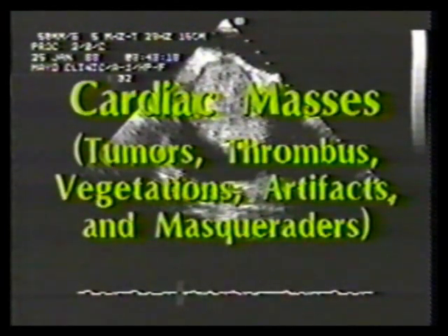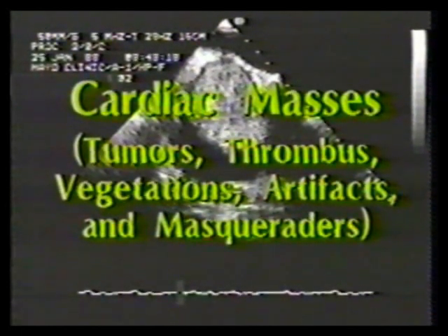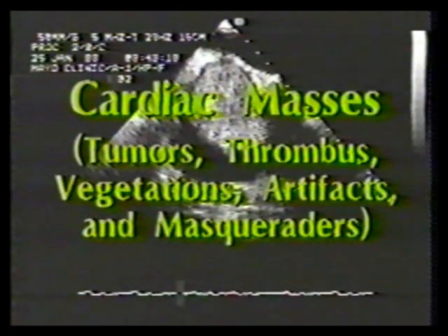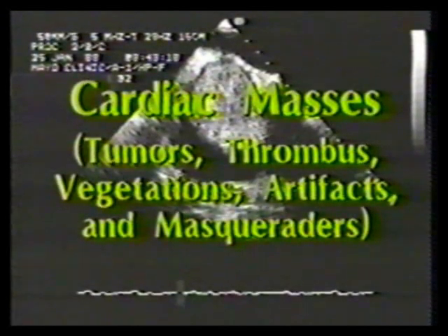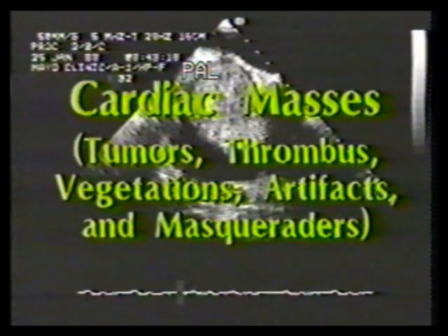This is the 10th presentation of the American College of Cardiology Video Seminar Series on echocardiography. The topic is cardiac masses and includes a discussion of cardiac tumors, thrombus, and vegetations. The topic of artifacts and masqueraders pertinent to the discussion will also be illustrated.